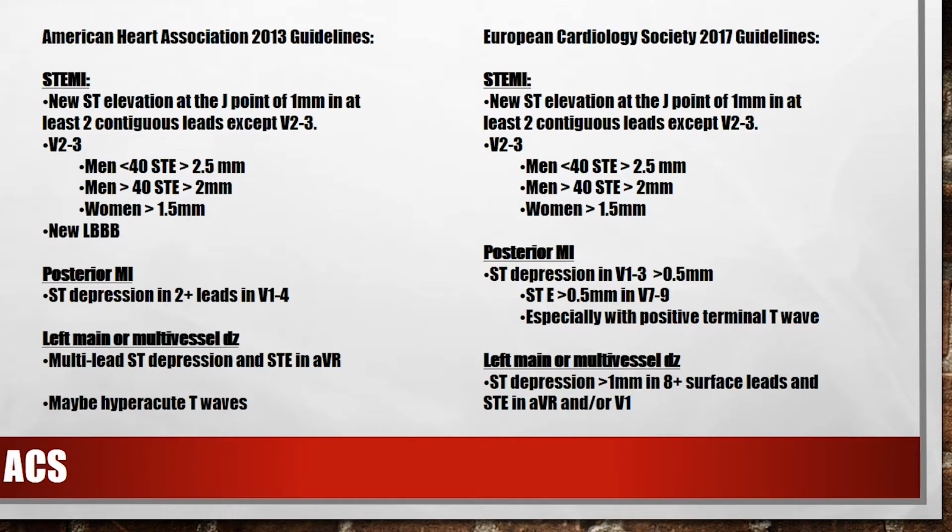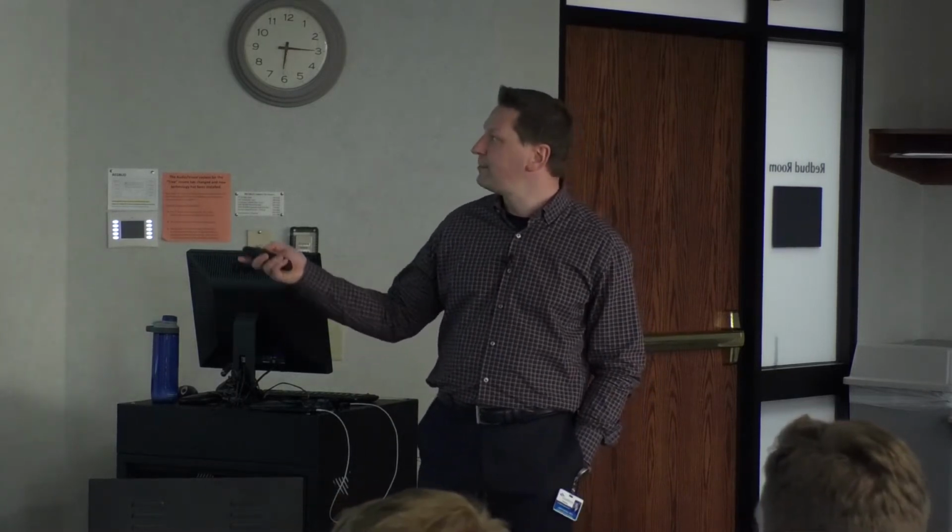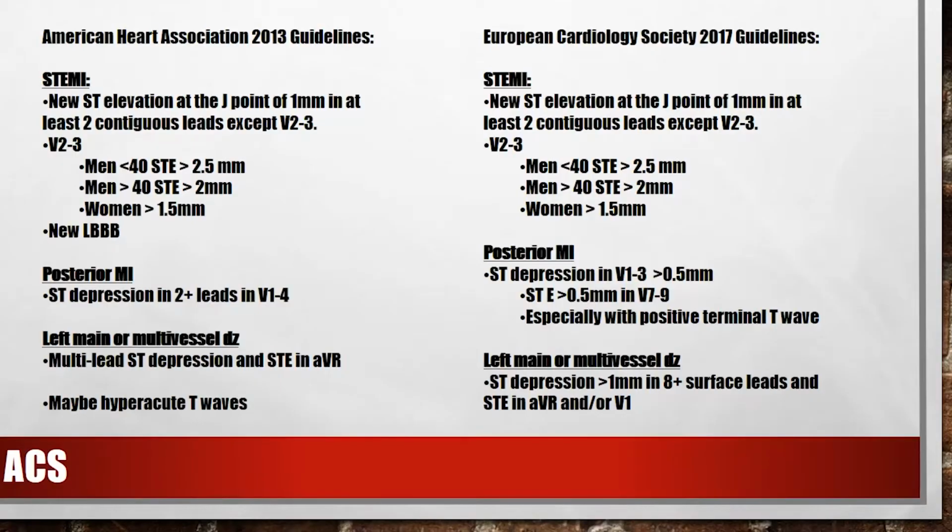If the patient has a new left bundle branch block and you are not a cardiologist, you won't be able to read whether or not they have ST elevation or not because left bundle branch block screws things up. It turns out there's actually a way to read through the left bundle branch block called the Sgarbossa criteria for anybody who wants to know. It's SGARBOSSA. All right, so all this is saying in all of these different things is that you have elevation in the appropriate territory, okay? So a STEMI in some territory means you have an infarction in that territory, okay?